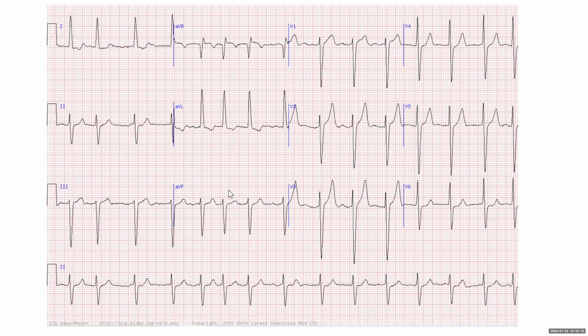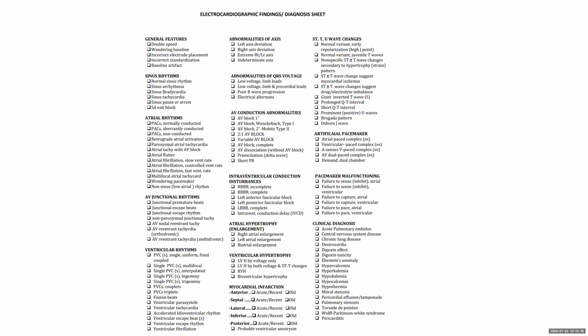Okay, are we ready? Maybe if this is the coding sheet, just stick with what's in the coding sheet itself. Sometimes we're just used to interpreting ECGs with things that are not on the code. So you guys mentioned AFib. That's one. LVH. Left axis deviation, ST-T changes secondary to hypertrophy, and then anything else?